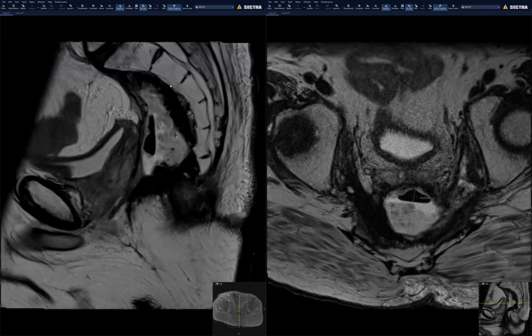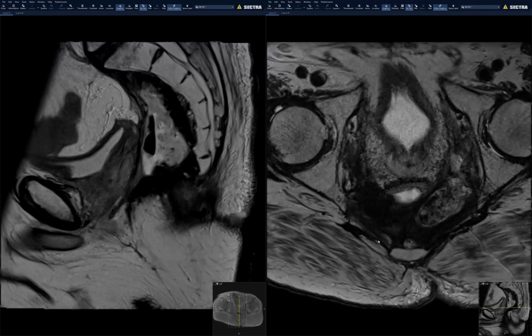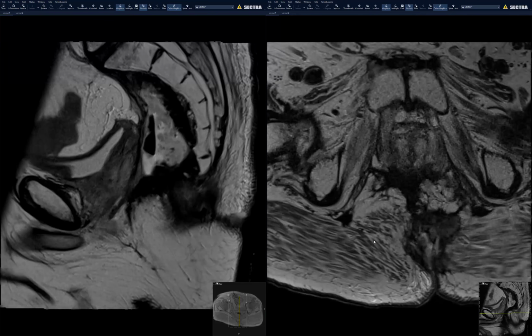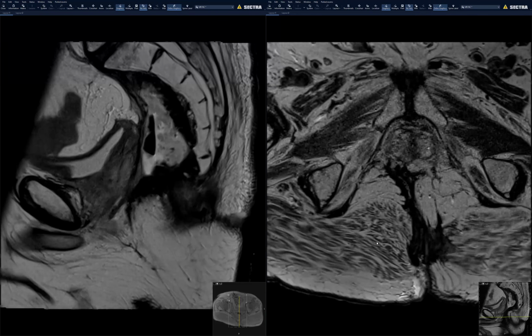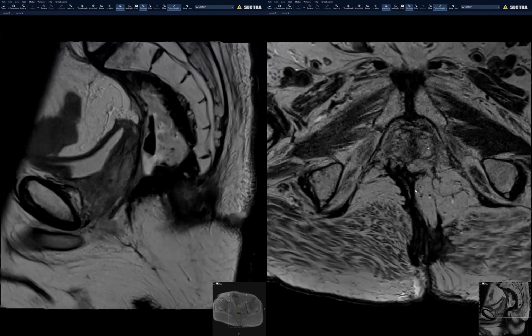Okay, Aarti, I can do a quick show and tell. Okay, great. So this is a 70-year-old guy with anal cancer. He's been treated. As you can obviously see, he has something going on at the surgical site, which is measured here. But this is more of, can you see something else? What do you think? I'm going to scroll down. Let me know if you see something else. It's just a show and tell thing. I didn't know about it. There's a flap here. Agreed.